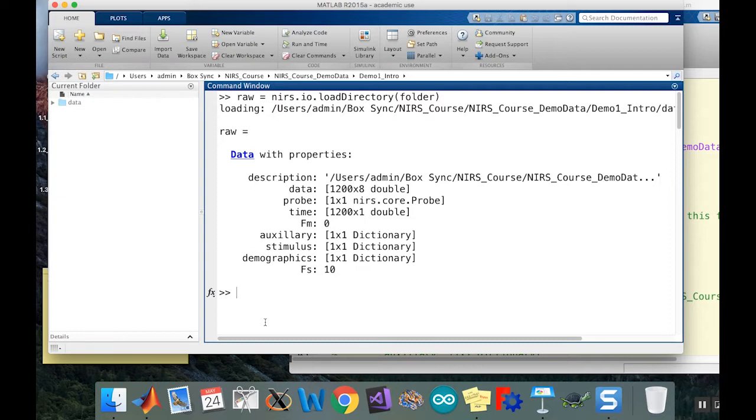This is an example. This is actually a dependent variable. So knowing the time, I can calculate the sample rate, right? So if I was to change the time vector here, it would automatically refresh to change the FS. This is calculated on the fly from there.